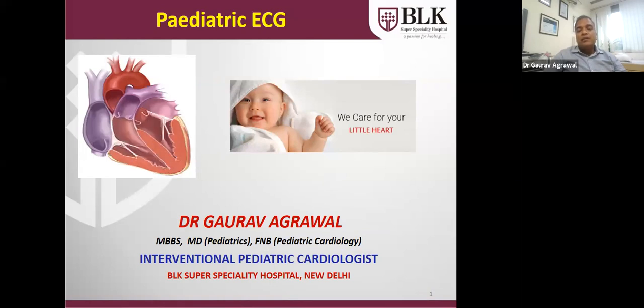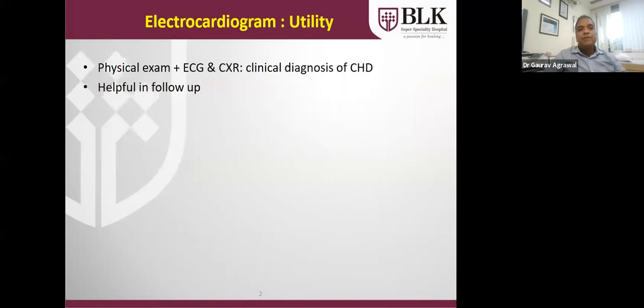Today the topic is pediatric ECG case-based discussion. First, I will brief the basics of pediatric ECG. Then, subsequently, I will take the cases in between.